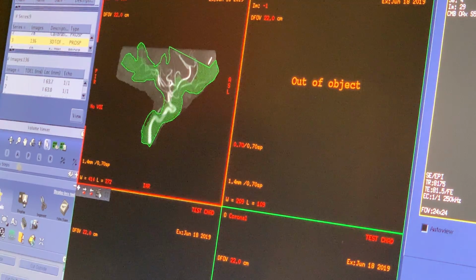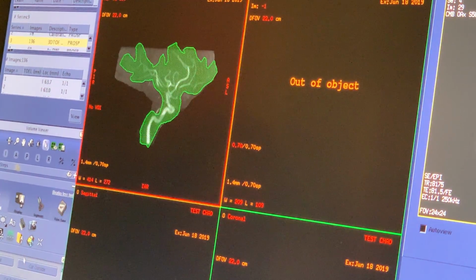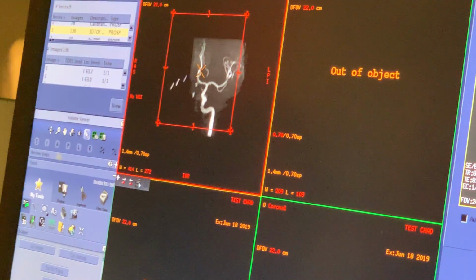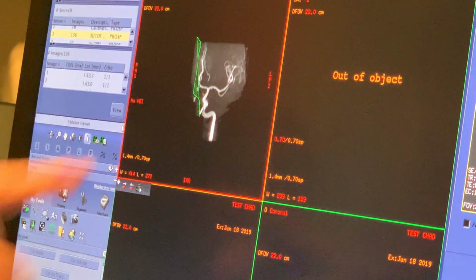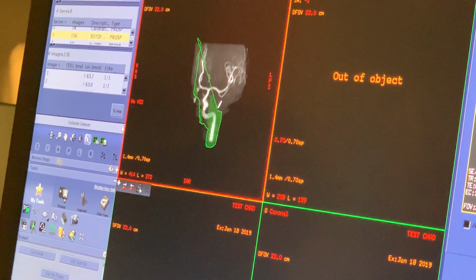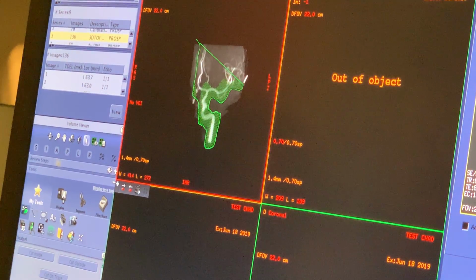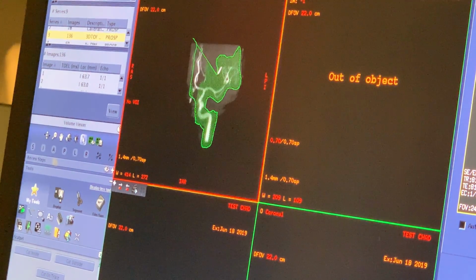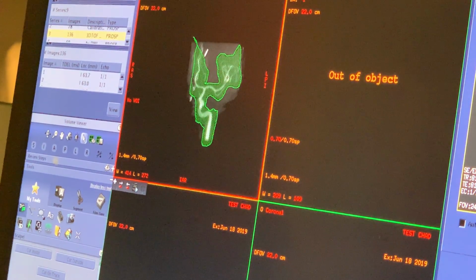If I go through around each little like this, and then if I go to the anterior and I do the same thing, I can just trim right up in here, go around here. Pituitary lives right there, and like that, and then you can come right into here. Right around like this. I think I've seen Dave do this, Dave Diffenderfer.